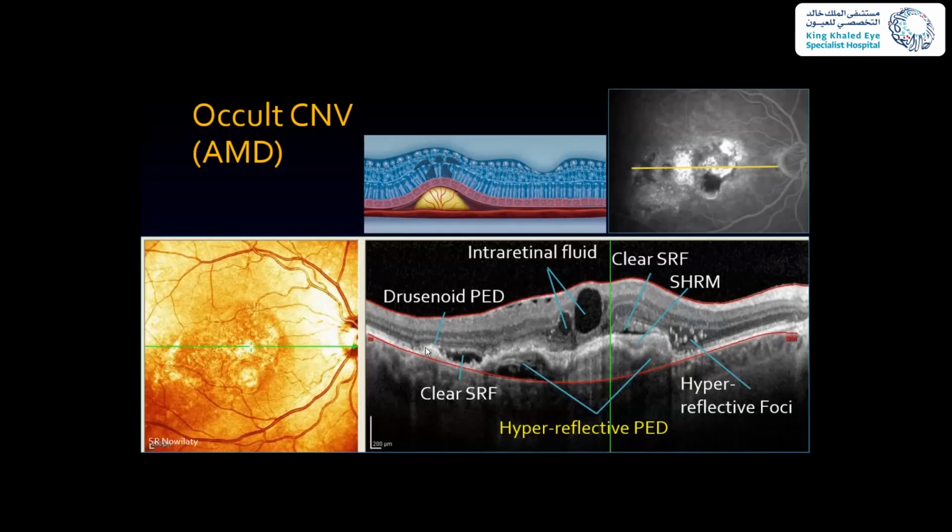Here you have a drusen. Here you have intraretinal fluid. And here, if you follow this, you can see that this is the neurosensory retina right there with shaggy photoreceptors. It still has some subretinal fluid, but it also has the subretinal hyperreflective material that we call SHRM, okay? Subretinal hyperreflective material, which means basically fluid that has become yellow and murky and dirty. But this is the membrane.